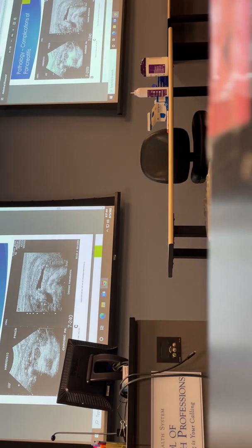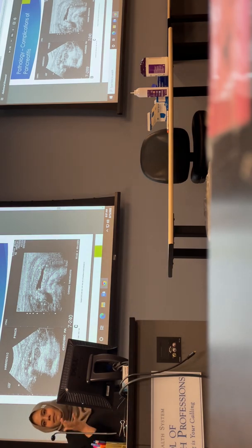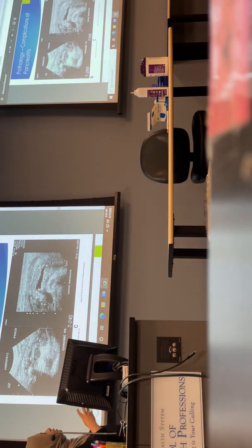And then once you guys get up to actual clinicals and things like that, if you have a patient like this and you're like, what's going on here? Is that the duct or a vascular structure? Put color Doppler on it. A duct will not light up with color. Okay, it's not carrying vascular fluids to or from, so it will not light up, versus any of your vascular structures will light up. So put color Doppler on it, and that should be able to distinguish one from the other. Okay.